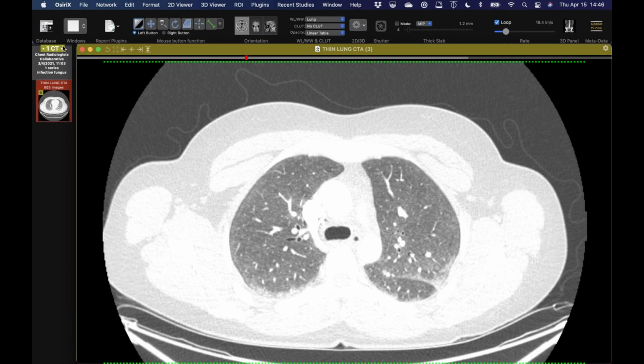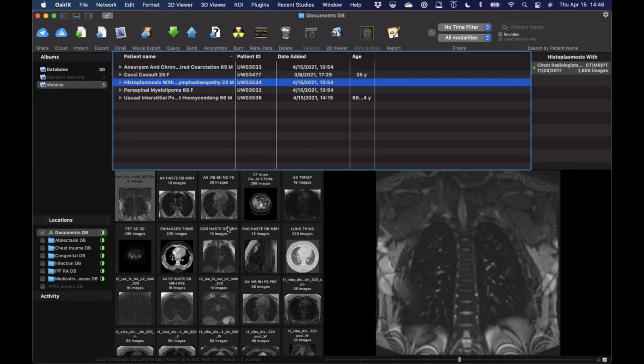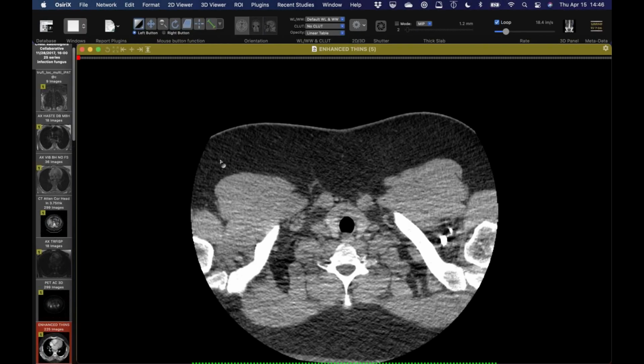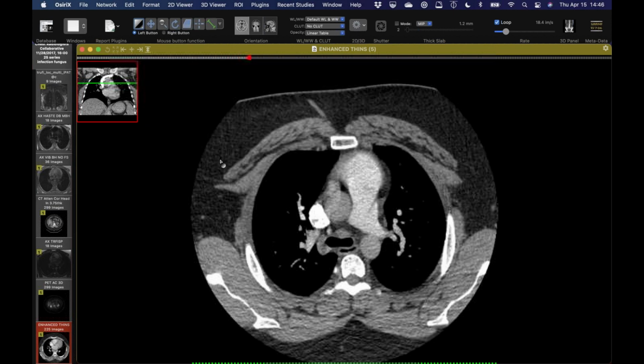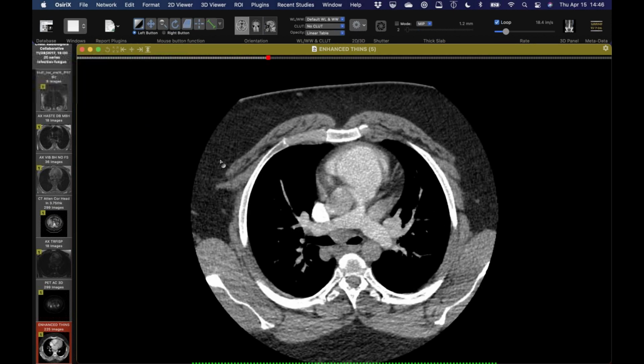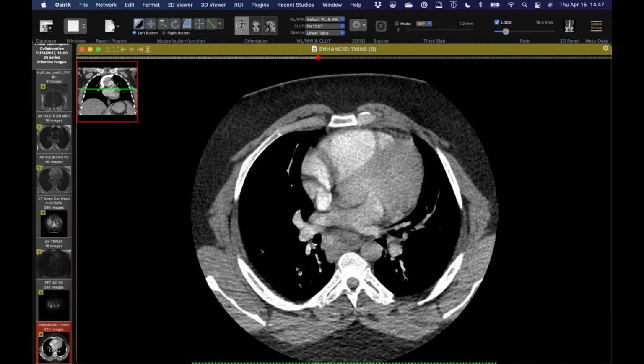But it just shows you how anchoring bias can be really dangerous because of one lab test or one anecdote. It's reasonable to think of cocci because she was exposed to it, but cocci is so endemic that she probably was exposed to the organism but wasn't infected. With miliary cocci she would be really sick, and you don't just get this pattern of centrilobular ground glass nodules.